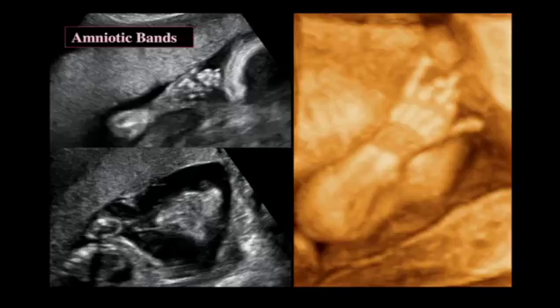Now, here is a fetus with amniotic band syndrome, and this was a very unfortunate fetus at about 26 weeks. And if you look at this image here, you'll see the face, the lips, and the nose, and you'll see this veil of bands that is really traversing right in front of the fetus, sort of like the fetus is wearing a veil. And if you look at the hand here, it has all the fingers together where you can't sort them out.